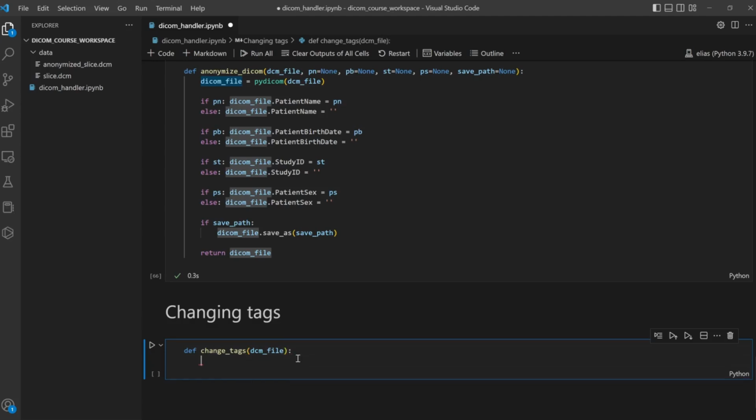Why I am giving it: if someone wants to change the information of a DICOM file, or for example, if you have a database that contains thousands of DICOM files, and you have, for example, an XML or TXT file containing the information of a DICOM that you want to change, you can use this function.